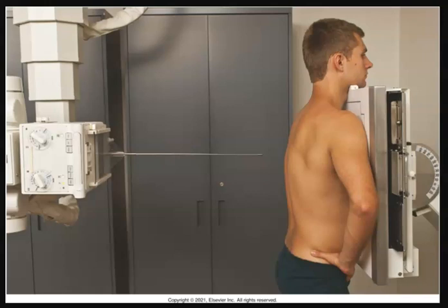This is going to be just a real short video trying to get you orientated with some different terminology so that when you go into the X-ray lab, there isn't a whole lot of jargon thrown at you all at once. So feel free to pause, rewind, fast forward, whatever you need to do here. This over here doesn't look exactly like we have in our X-ray room, but in general, it's the same.